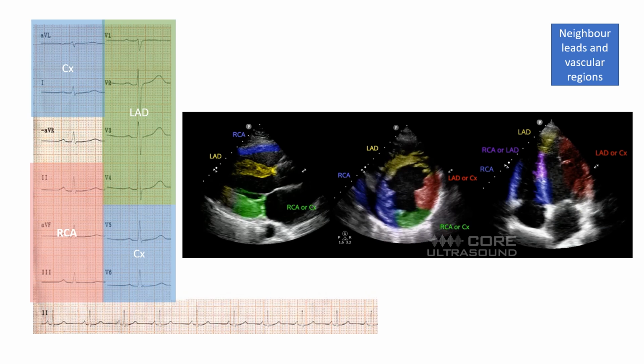So we have this correlation. Chest pain correlated with this, with the right area. Sorry for the color differences here. So RCA would be the blue one here. And then you have a good case, right, to tell to your PCI center, even if they don't believe in the OMI criteria or read different literature.